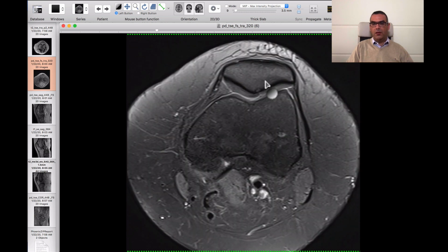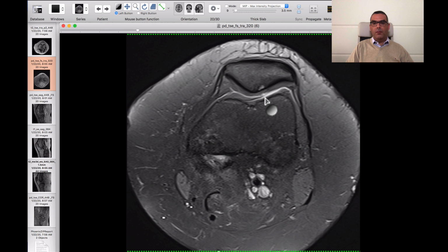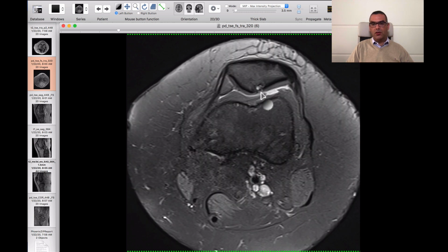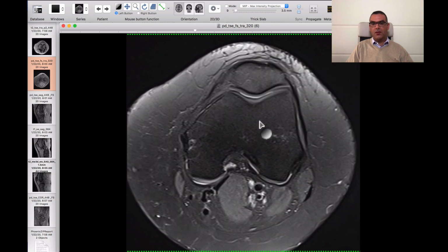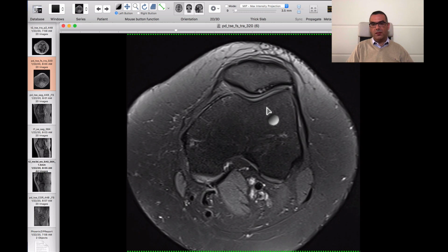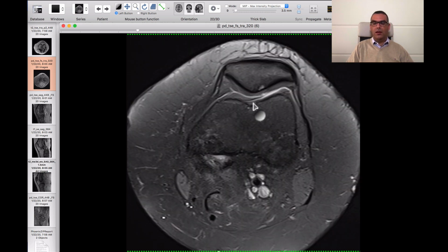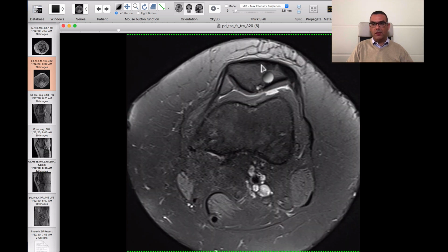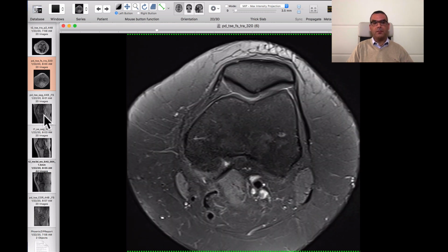Right here, the articular cartilage is thinned out. There is an area of chondropathy, and it appears to involve most of the thickness of the retropatellar cartilage at the lateral facet with subchondral cystic changes. So this is a chondromalacia patelli. You can call this patellar chondromalacia grade 3, or you can just identify and describe the chondropathy, but you just have to highlight it because this may be a source of chronic pain for the patient.